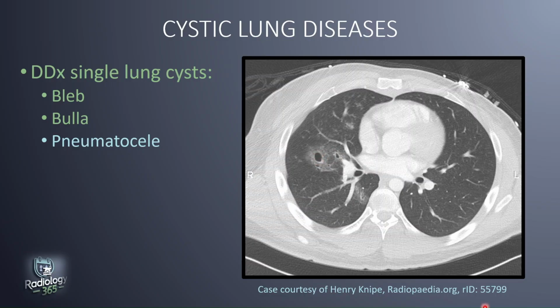In the setting of trauma, the cystic spaces are traumatic pneumatocysts with the areas of ground glass opacity consistent with small pulmonary contusions. On follow-up imaging, these changes resolved later on, about 2 months or so. And this is to be expected in the case of traumatic pneumatocysts. Once the inciting condition goes away, the pneumatocysts would also go away. So if it were a pneumonia associated pneumatocyst, once the pneumonia is treated, the pneumatocyst should also go away.